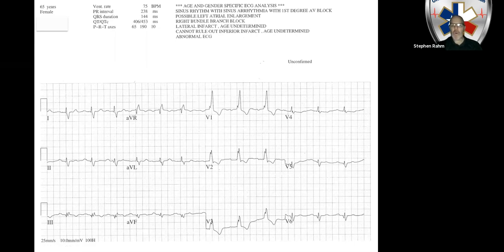But if I were to draw a horizontal line through this entire QRS complex, and again, I use QRS very generically, the first complete triangle that I would make is pointed up. So therefore, this tells me this is a right bundle branch block. It has a QRS of 144 milliseconds. The underlying rhythm is sinus in nature because you can see P waves down here in lead 2.